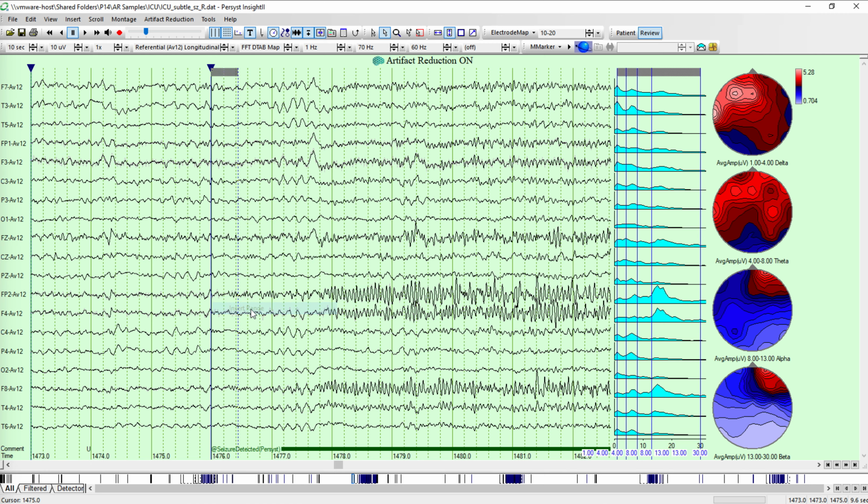I'm going to do insert range, and I'm going to mark a couple of seconds. Now, FFT parameters, FFT points per window. You're defining the number of points for it to calculate the amplitude by frequency. With default settings and typical scalp sampling rates, if the range is less than a second, it's going to blank out the display. It doesn't have enough points. It's editable, but again, that's getting outside the scope of what we're doing here. Happy to answer questions about that through email or create another screencast getting into that detail.